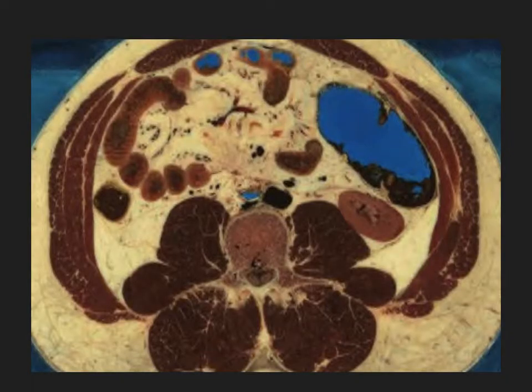This is an actual abdominal cut of a preparation of the abdomen, in which we need to remember the relationship and the landmarks we are going to use. As you can see on the screen, both vessels, the aorta and the inferior vena cava, are slightly anterior to the spine, to the vertebral body. And this is exactly the landmark we're going to use to identify our two main vessels.